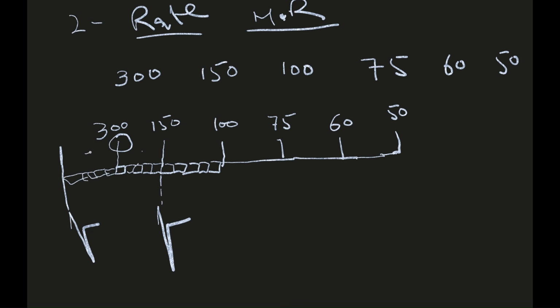take the small squares, not the smallest squares, but the small squares. Count the small squares that come between two QRS complexes. For example, from this complex to this complex, there are two small squares, not the smallest squares, but small squares. This is 1, this is 2.